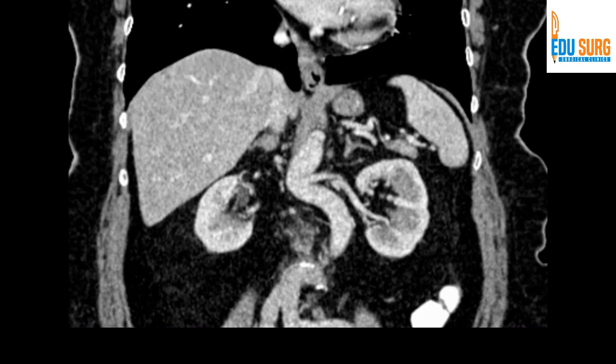So this is the third part in our CT viewing series, and today we are going to see the formation and course of the portal vein. This is because last time we saw the celiac axis, so I thought that we'll complete upper abdomen, finish the portal phase, and then go ahead with organs and the CT anatomy of the lower abdomen. So we will keep modifying our approach as we go ahead. So let's dive into the CT console now.